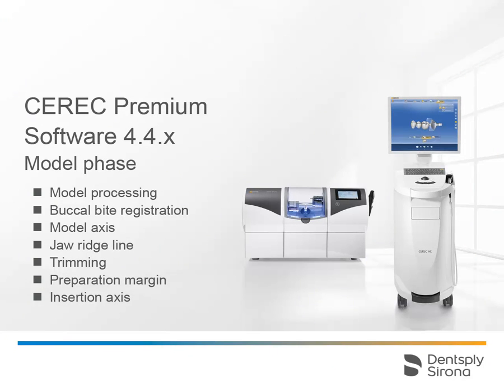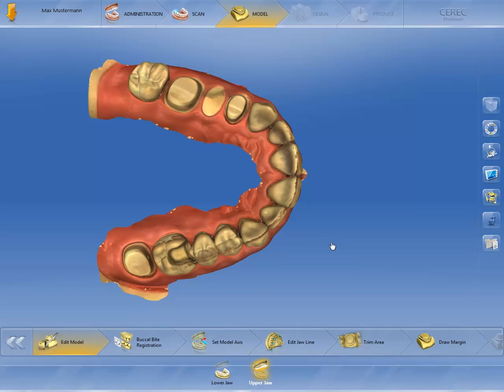This video offers an insight into the third phase, the model phase. In this phase, you can optimize the model and also define important settings and alignments. In the model phase, you work with the virtual model that was calculated using the recorded image catalogs. The step-by-step menu guides you through all 7 steps.